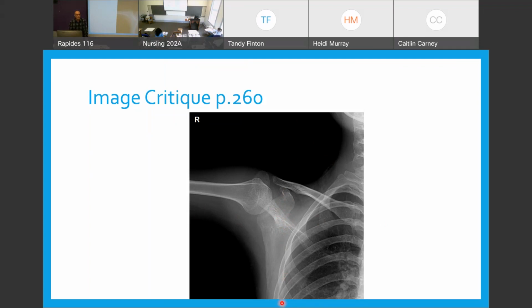AP scapula? AP scapula, does it meet criteria? What's clipped? The inferior angle. Look how much space you got up here. So you were doing good, but you're jumping too quick to a conclusion. Look at your arm first, then look at the central ray. The central ray would have been the giveaway. There's your coracoid right there, and we know it's 2 inches down. It's dead center of the scapula, so we know it's something to do with the scapula. I don't see a Y. I see half a chest, so we had to do that obliteration of lung markings. Does this kind of make sense to you?